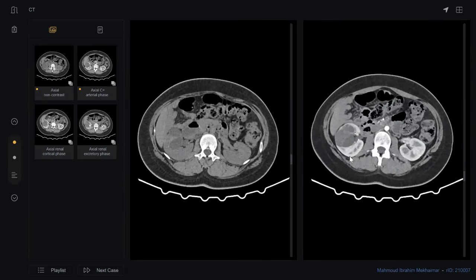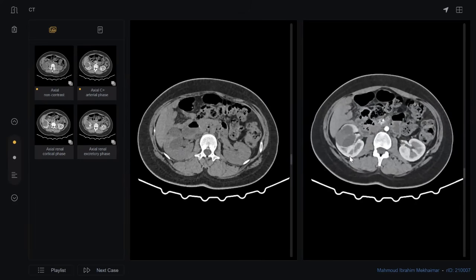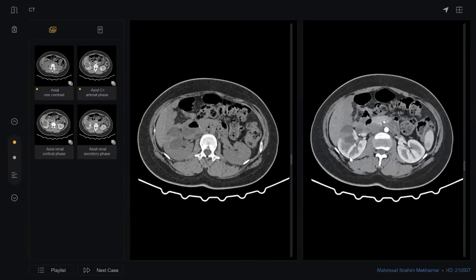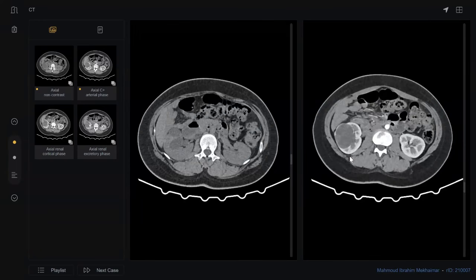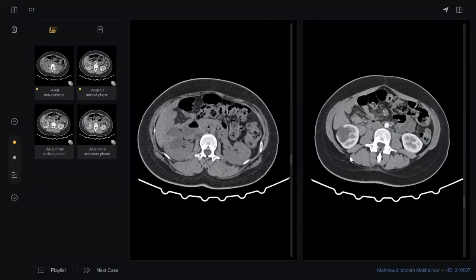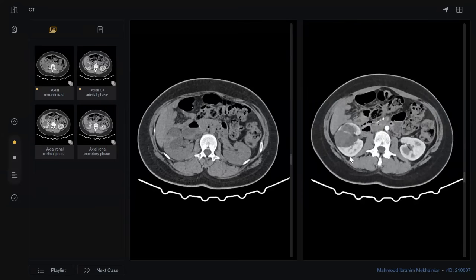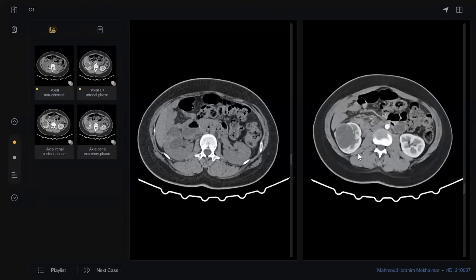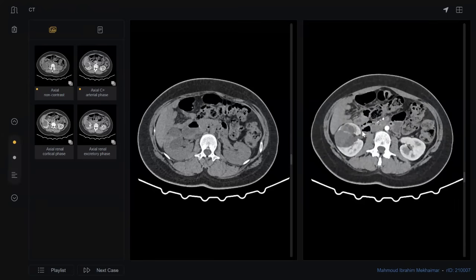So what's your diagnosis and the classification for this cyst? Okay, so this is a cyst with hemorrhage. The margins of the cyst appear to be smooth, and I don't see any calcification within the cyst, and no enhancing septa are noted within the cyst. I think this is a grade two cystic lesion with hemorrhage. What about this septum, the only enhanced one?